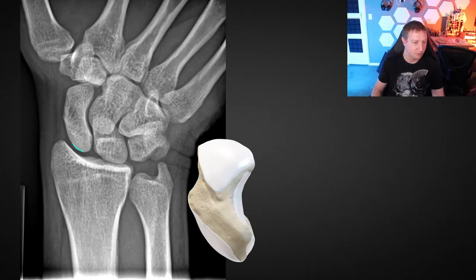You can see the radial articular surface comes up here and ends, and then we have this bare area up until we get to the trapezium and trapezoid articular surfaces. When you can see that bare area laid out nicely, you're seeing the scaphoid lifted up from the tension placed under ulnar deviation. Another thing ulnar deviation is great for is that it allows us to see the scapholunate joint a bit better and applies some stress there. So if the scapholunate ligament is incompetent or torn, you'll see widening or diastasis at that site.